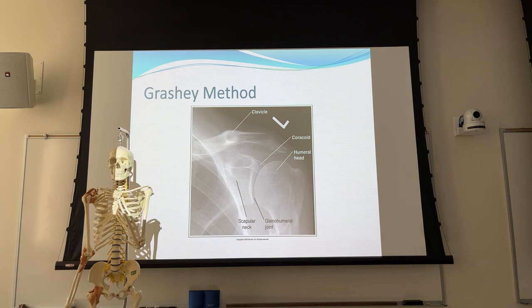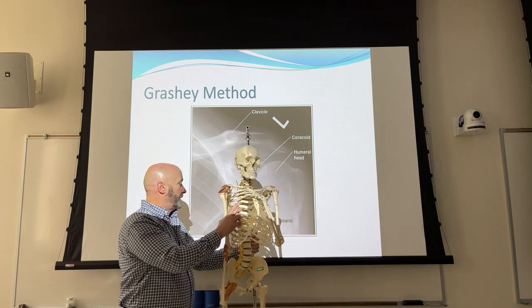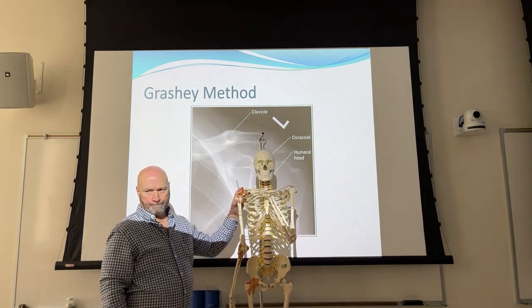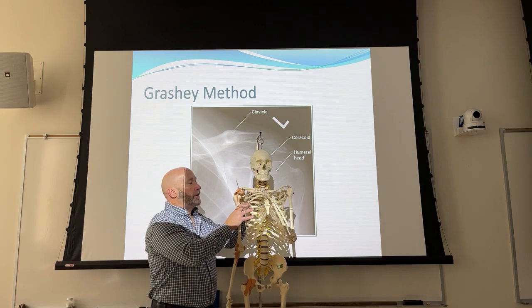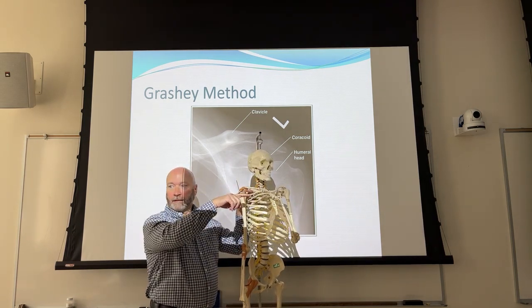If it's not, then you're going to look at the coracoid process, and we're going to look back at this guy. So if we were shooting straight AP, where is the coracoid process? Right there, yeah, stick it straight out the front, right? So as we oblique the patient up, the coracoid process is being projected more laterally, right?